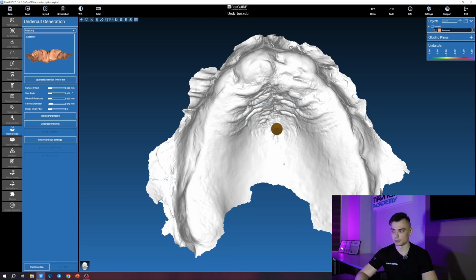That's the first point. And the second important point to note is that this radiopaque template, which I showed you earlier, is actually going to serve as the future prototype of the surgical guide that we will eventually use in the oral cavity. What does this mean?